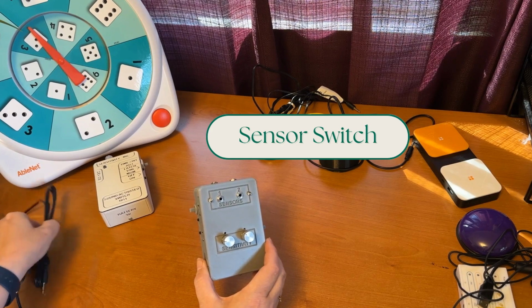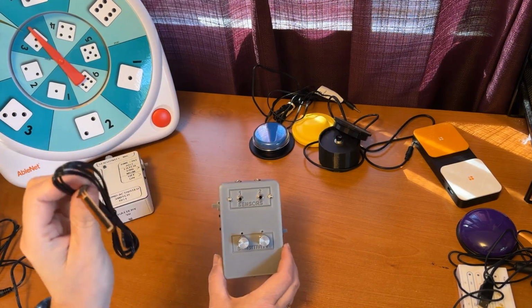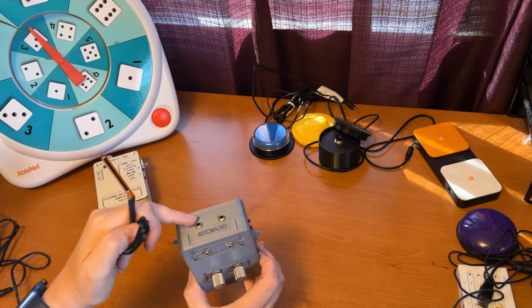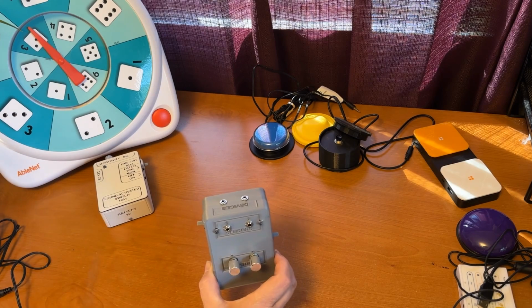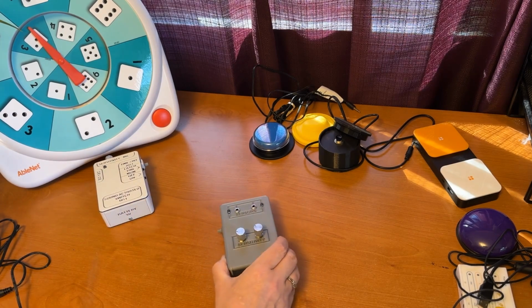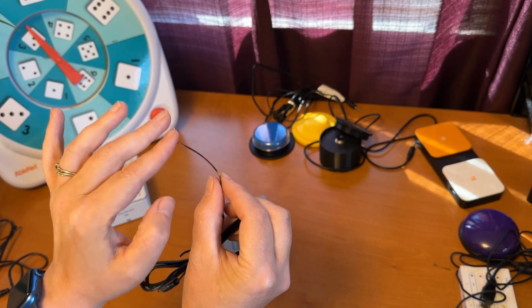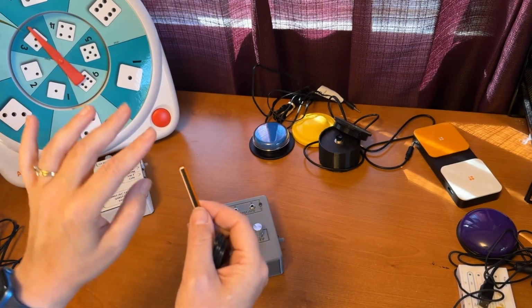Another type of switch trigger is a sensor switch. Here's an example of one of the sensors. This can be used by plugging the sensor into this device and then this device out to whatever switch-activated device, like our Mickey or our alternate spinner here. And this time, this switch actually works by being bent. So this works really well if you have a user with limited mobility.